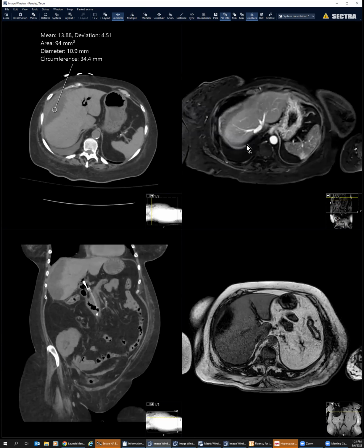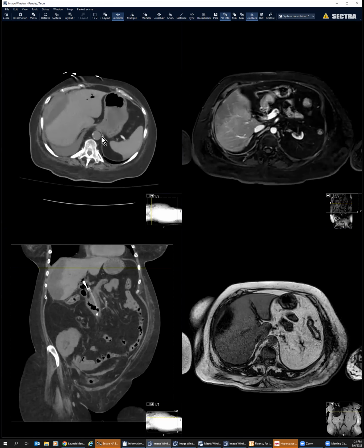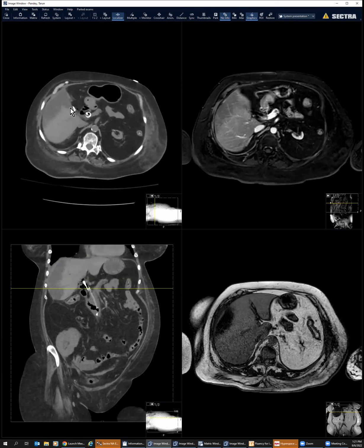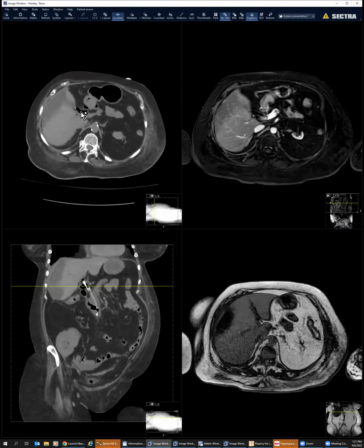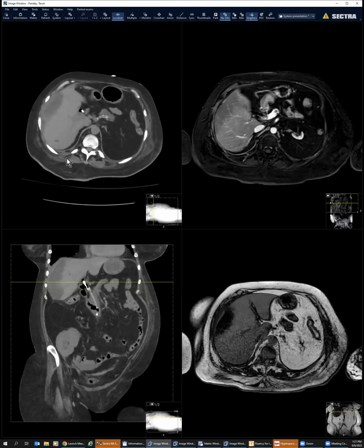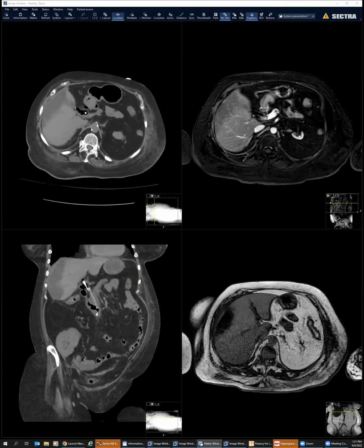That was a fake out. I think all the fat was intravoxel. What a great case. Yeah, the thing which also misled was that you could actually make out a track from where they removed the gallbladder, and the question was biloma, and we just got misled into that. Do we have the pre-op imaging? I don't think so. I think it was an outside scan, the surgery was outside. Okay, that was a quick one from me. Nice.